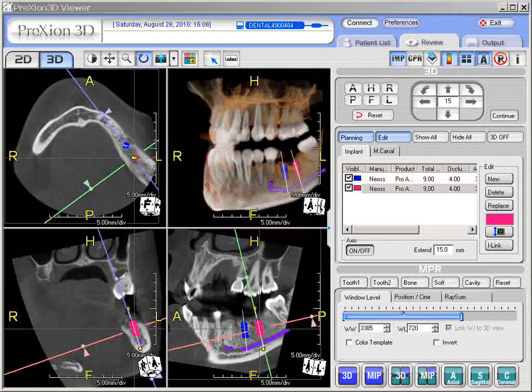Well, that about wraps it up here for the planning for implant shapes. Remember, these are shapes. They are not the real type like STL files that you get. So they're shapes from the implant library. So remember, they're very nice to fill in edentulous areas rather than just using a straight volume.